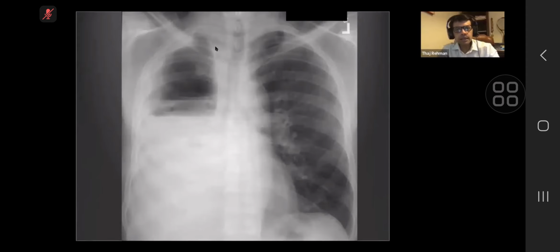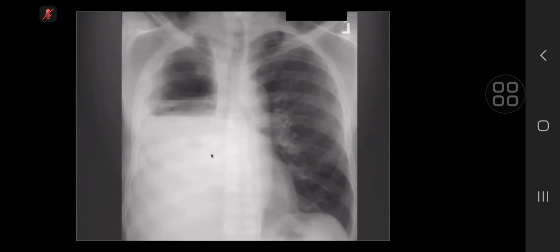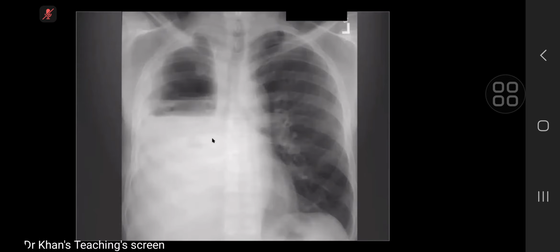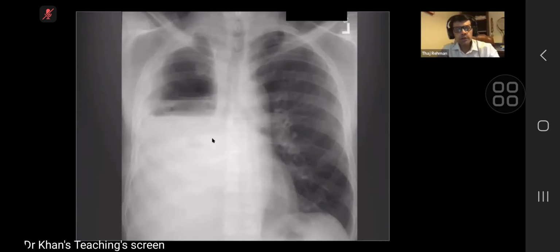And can you see the clips? Yes, I can see them now. So okay, good. What is happening here? This patient's had a previous surgery, and post-surgical they've developed what we call... So this, if you know it, you know it. Otherwise, there's no way to guess it or arrive at a diagnosis. So I'm going to show you. Keep these abnormalities in mind: air bubbles, air fluid levels.